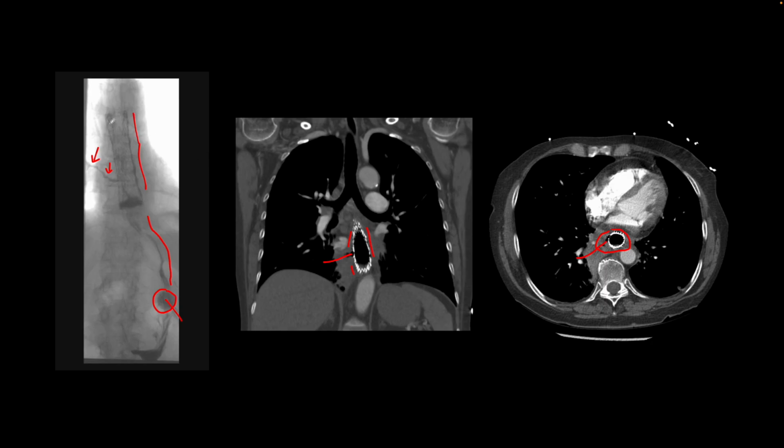And so this stent is made out of metal, and it's a scaffold. It's an uncovered stent, meaning that the metallic scaffold has holes where, if there is a track like this, or like I showed you here, contrast can leak from the lumen outside. And so this is a perforated esophageal tumor.